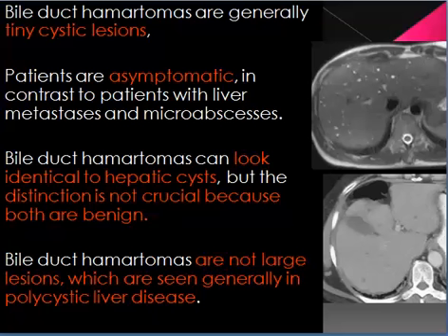Another case, patients are asymptomatic in contrast to patients with liver deposits or microabscesses, and biliary hamartomas look identical to hepatic cysts, but the distinction is not crucial because both are benign. They are not large lesions, which are seen generally in polycystic disease.